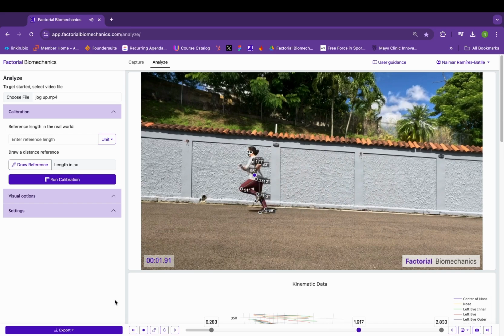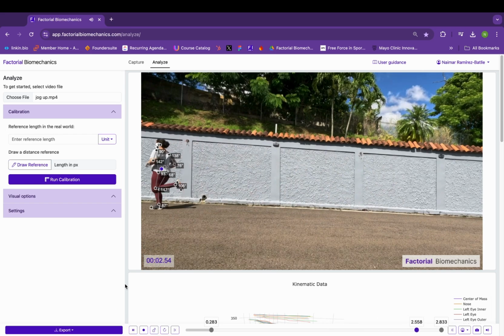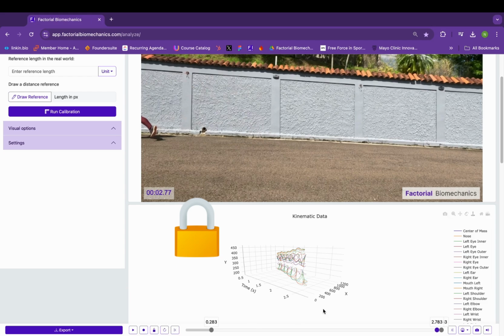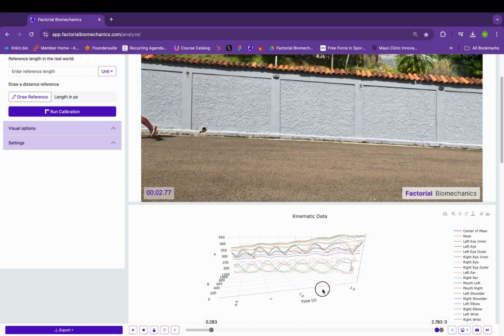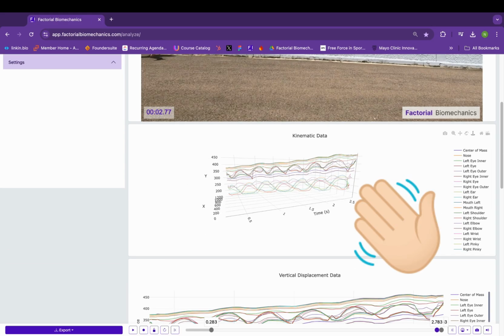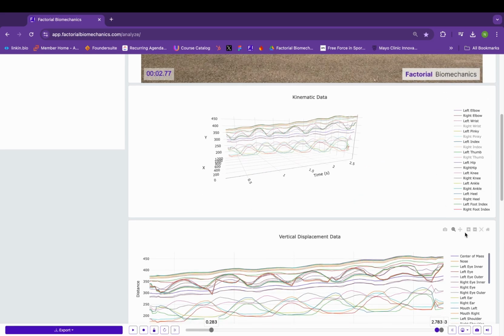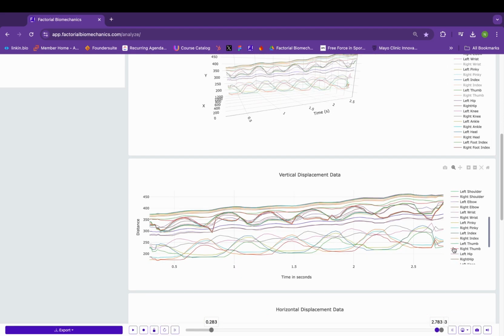You can also lock the inference to avoid unwanted rerunning of the model by clicking on the lock icon. Here, I'm turning off the traces for all the right-hand key points because they're not fully visible in many areas, and therefore the traces are less accurate and a little bit distracting.